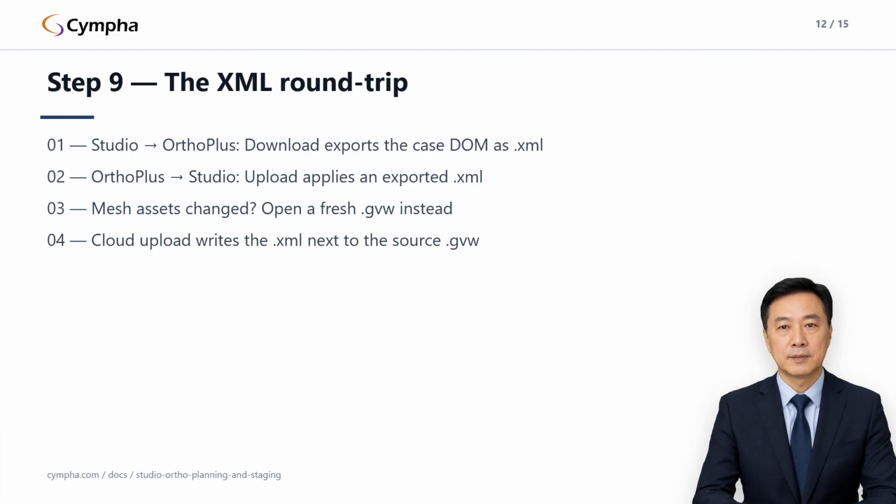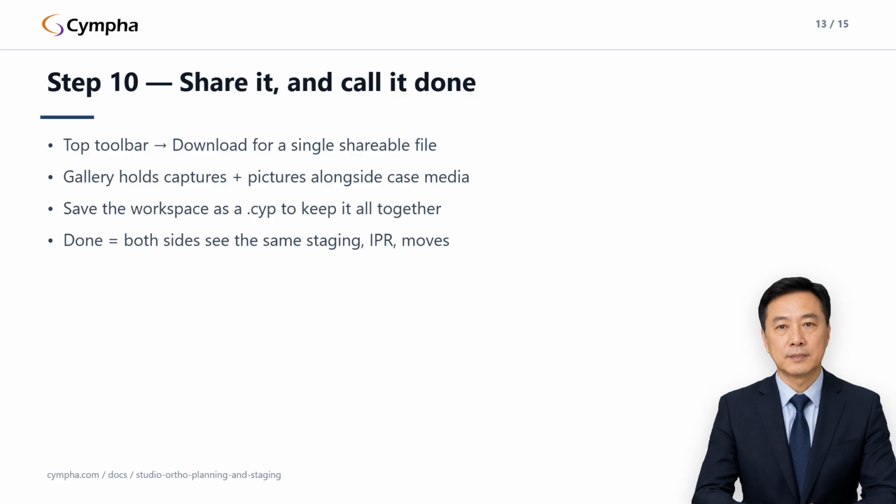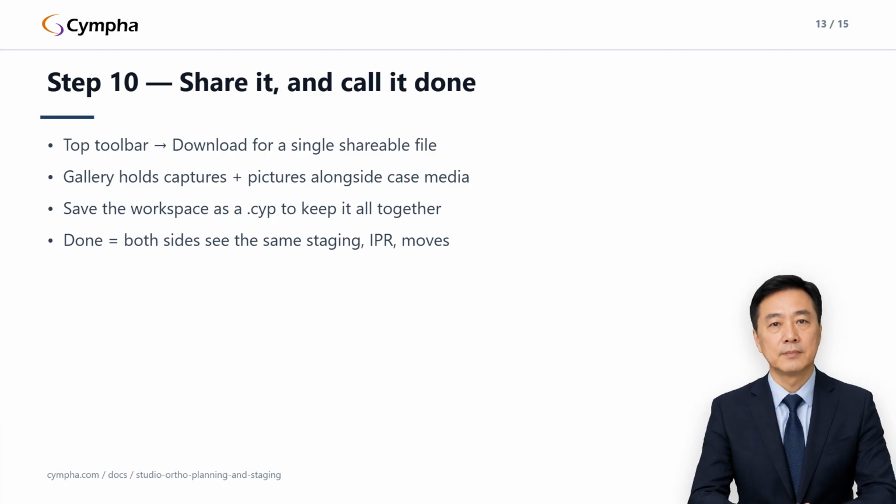And what does done look like? After the XML round trip, the case is genuinely in sync. The next reviewer can open either Studio or Ortho Plus and see your staging changes, your IPR adjustments, and your tooth moves. That's the whole promise of this workflow. The browser is a first-class seat at the planning table, not a read-only preview.